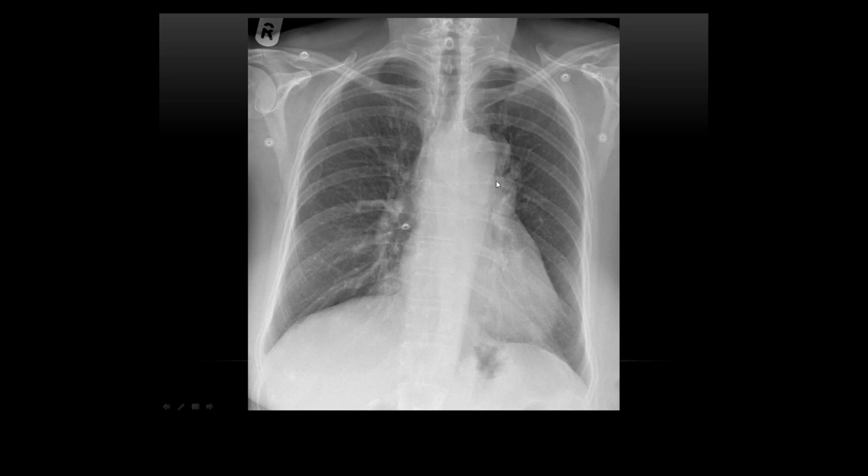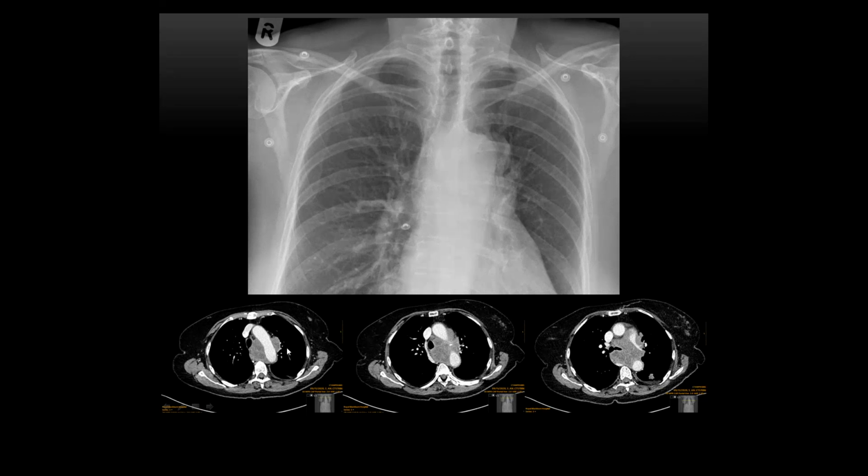You're able to see that? Now this is actually one where it's not an AP window, because your AP window is actually normal. You see that concavity there. So that's a lung mass. Can everyone see that? And then you can see it here, and it's invading the mediastinum.